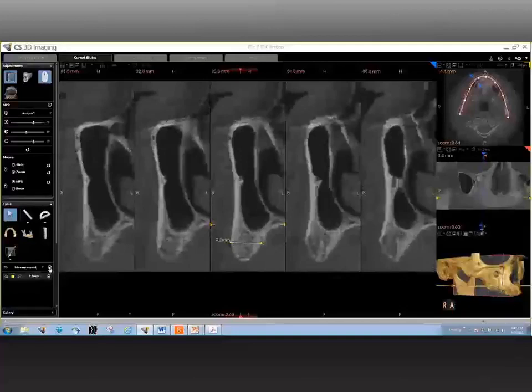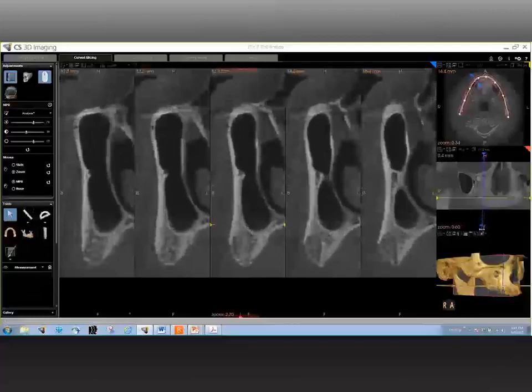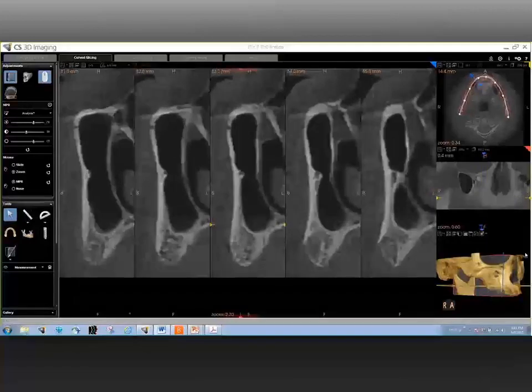And now you see there's even better gain. Even the quality of bone has increased in there. You see more trabeculation of the bone. You see the cortical bone seems to be a little bit more intact, and those kind of things. Now, the key point to note is that just on one side of the patient, you've seen the variation all the way from non-existent ridge to ridge that could go up to like 8, 9, or 10 millimeters in height.